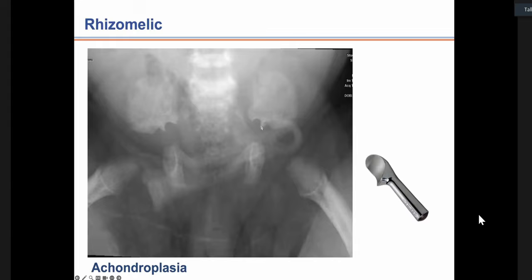So if you remember those features, it is helpful in making the diagnosis of achondroplasia. The short rib polydactyly syndromes are the other conditions that will give you a trident acetabulum, but they will not have this ice cream scoop. To be fair, I don't know another condition that gives you this appearance. I would go as far as saying that it's pathognomonic of achondroplasia.